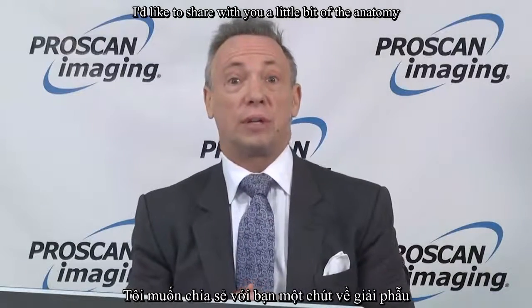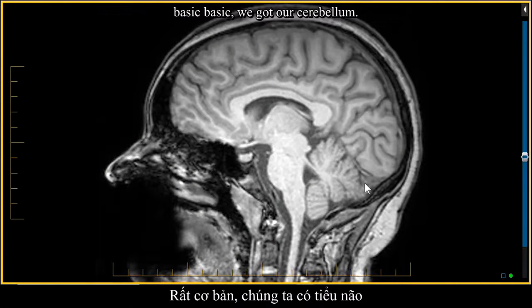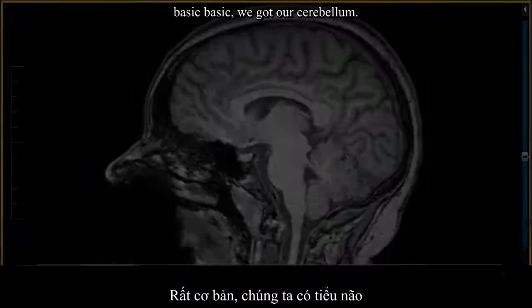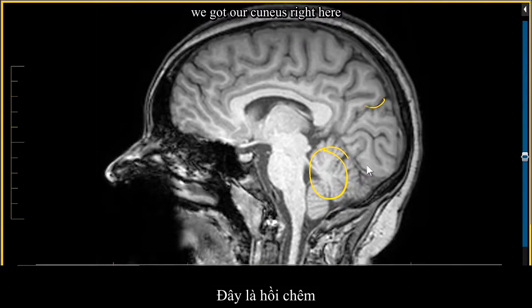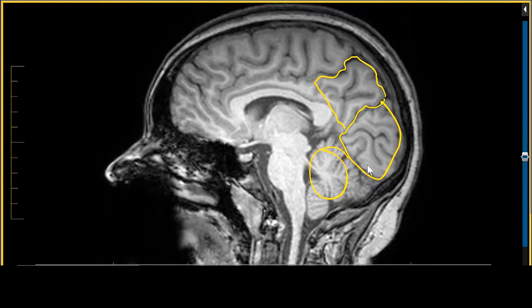I'd like to share with you a little bit of the anatomy and the surrounding neuroanatomy of the Sylvian fissure and the superior temporal sulcus. So let's start out in the midline, basic. We've got our cerebellum, we've got our cuneus right here, our precuneus right there, and then our paracentral lobule.